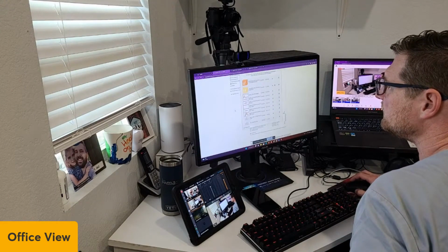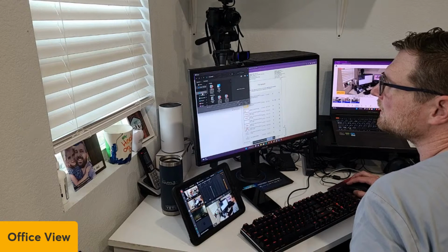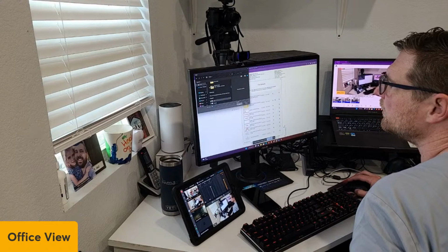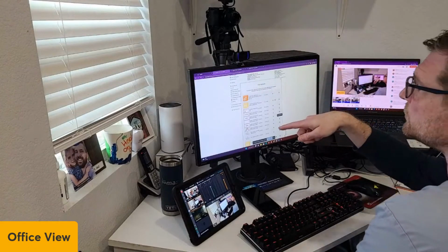and I'll select files from the computer. It opens this thing. I go to desktop. Oh, sorry, I go home. Usually it's the top one. This thing is running really slow because I'm live. So there's the 100, what I just used, open. And it's going to upload it in there. And then you go in and you manually base it just like that. Or you can go to 3D Command Center and let EasyRx base it for you if you trust it.